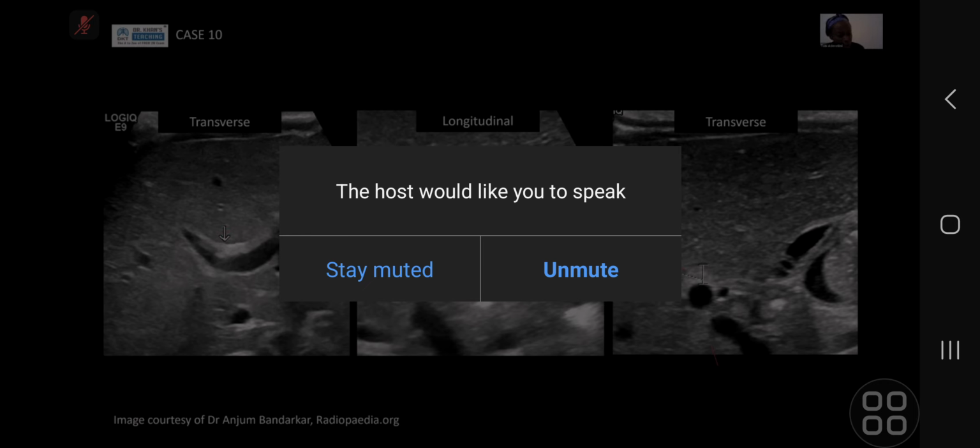The other signs that complement the diagnosis are if your gallbladder is abnormal. So you can either get an absent gallbladder, a small gallbladder, or an irregular gallbladder. If it's less than 2 centimeters in length, then that suggests that your gallbladder is small. And this has to be on a well-fasted child.